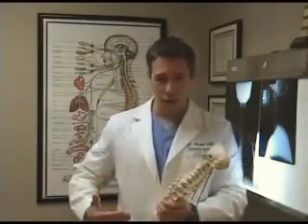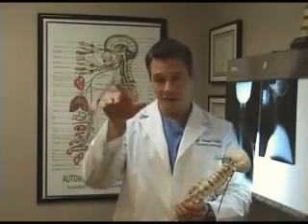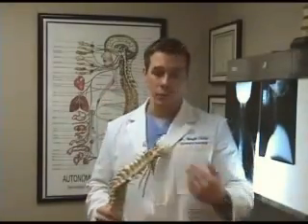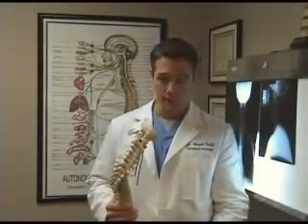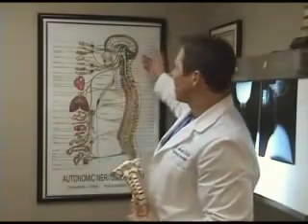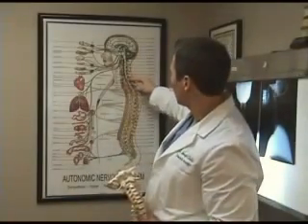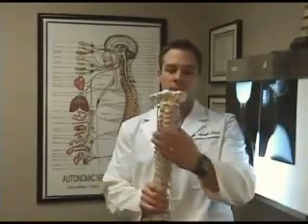We're going to go over specific X-rays so you can really understand when you come back and look at your own X-rays, you're going to be able to point right out and say, oh, Dr. Childs or Dr. Durr, I see where and the reason why I have this problem. I can see that my discs are degenerating in this area. Okay? So again, the spine should have three curves from the side, and you can look at it right here. It's in every anatomy book. You should have a curve in the neck, a curve in the mid-back, and a curve in the lower back, and the spine should be nice and straight from the front.